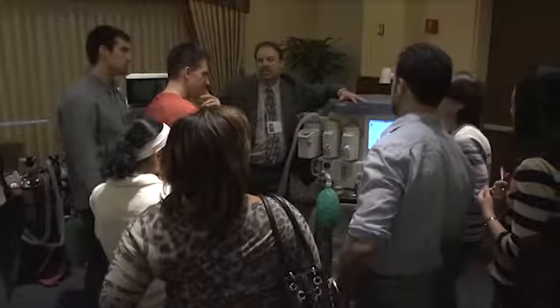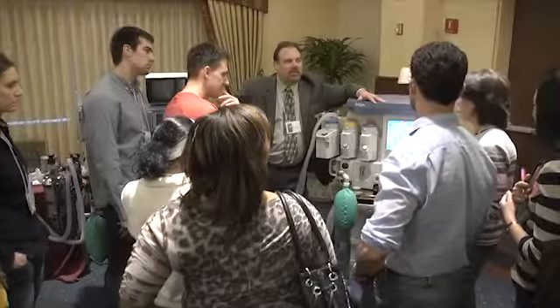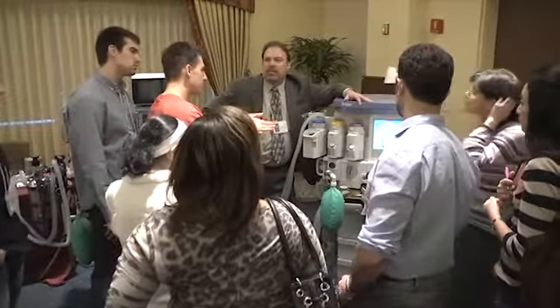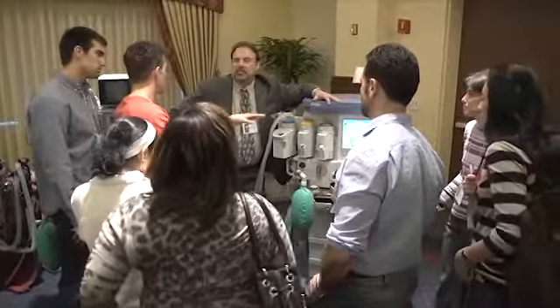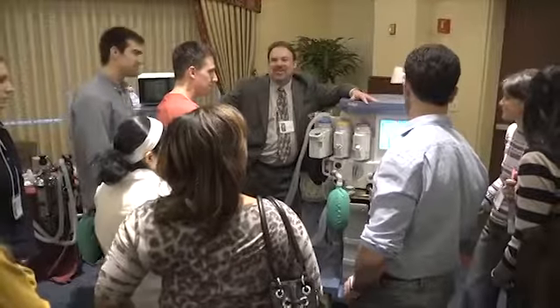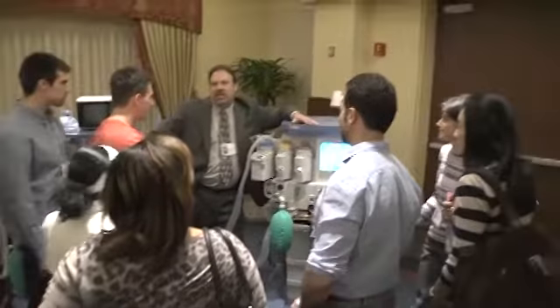The patient may not necessarily be apneic. You may choose to assist, or putting them on pressure support may not be enough. I've still seen it go off when I've been assisting, and then it's just annoying. Can you change it? Because again, you're past 15 seconds and you can't get a breath. You cannot disable it, right?